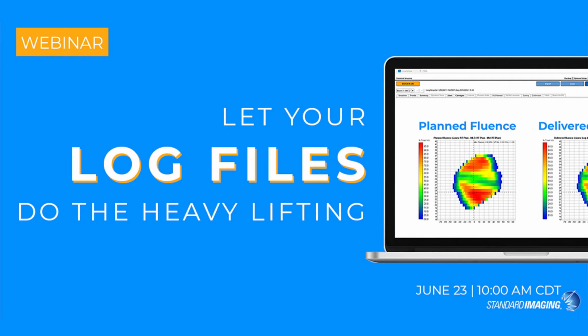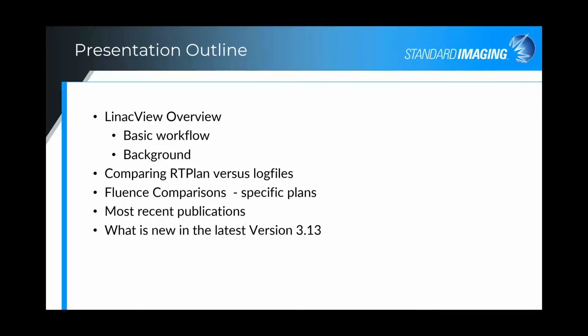So for today's presentation, I'll begin with an overview of the basic workflow, how and why log files are useful for plan comparisons, in particular the Fluence comparison, which is useful for the pass-fail criteria based on gamma analysis for patient-specific QA. I'll show some examples of specific plan Fluence analysis.